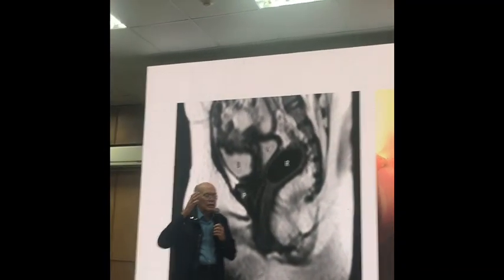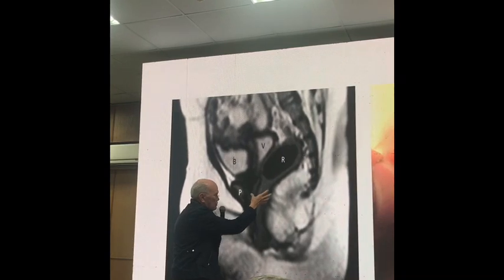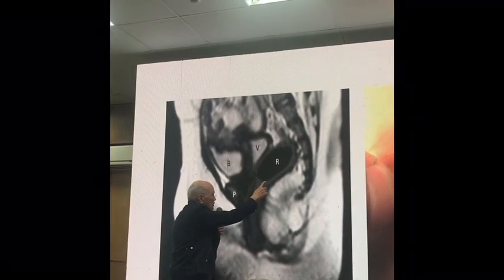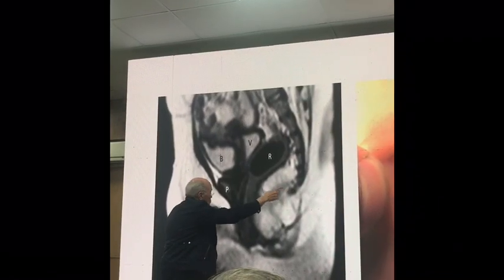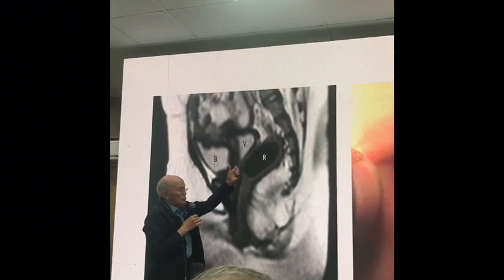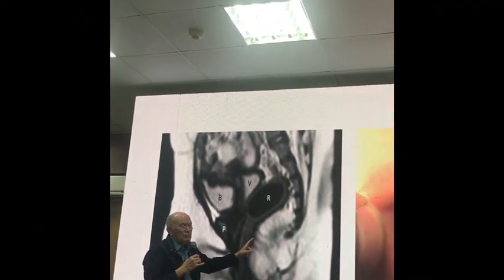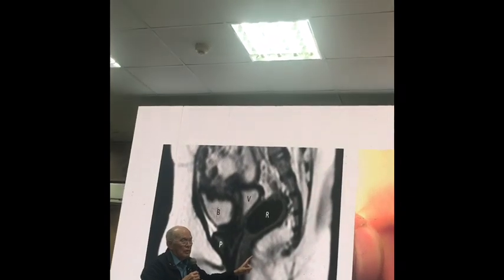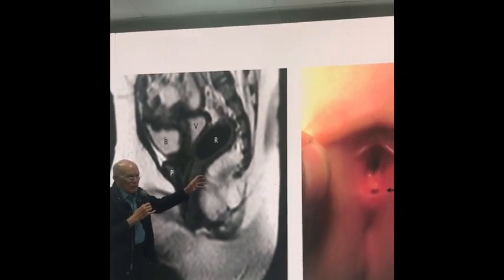That's the old idea that comes from the time of 1953 from Dr. Stephens. So if you don't put hydrostatic pressure, this never opens. I don't know if the rectum is here or here or here, but I do know that from the pubococcygeal line down, all this is muscle. And unless you put hydrostatic pressure, you will never know the real location of the rectum. Keep that in mind. No hydrostatic pressure, then learn to make this anatomic diagnosis.